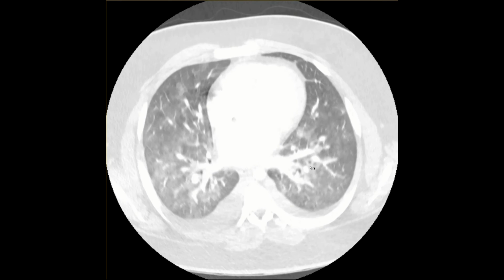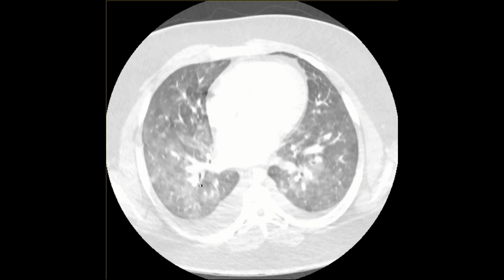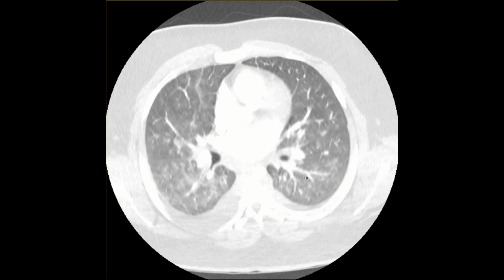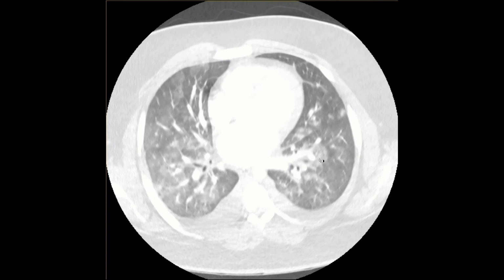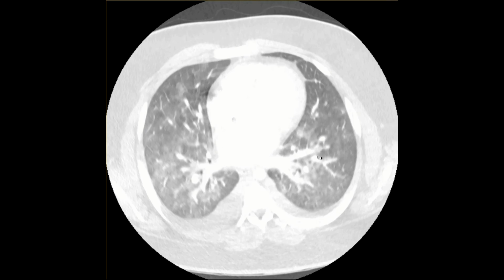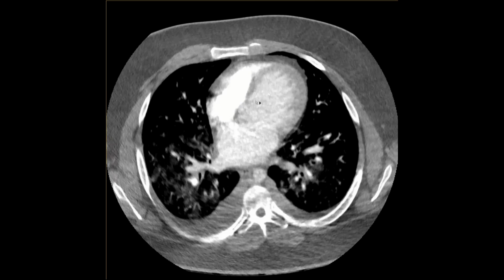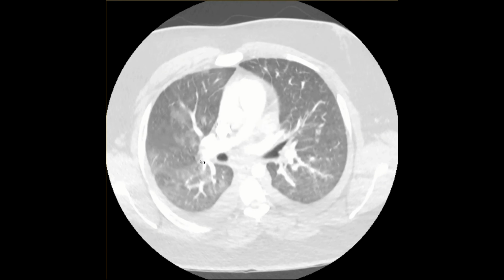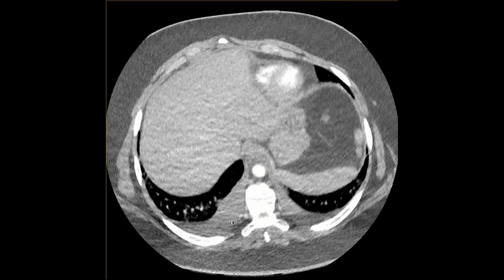The thickened airways, right here is an airway that's got a thick wall. Here, this airway has a thick wall. That's also interstitial edema. But when the heart failure gets really bad, it can spill out into the air spaces of the lungs, and we call that alveolar edema. So this whole picture together, right? Let's window it a little bit differently. The whole picture together, we have a big heart with a dilated left atrium, we have interstitial edema, we also have alveolar edema, and we have bilateral pleural effusions.